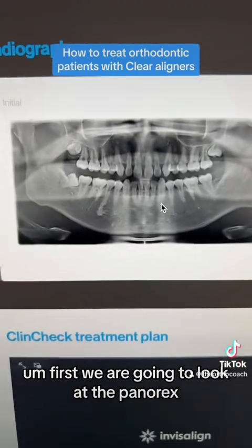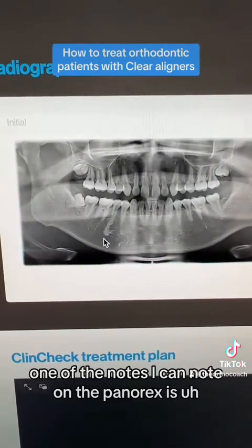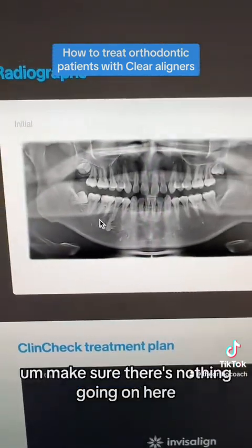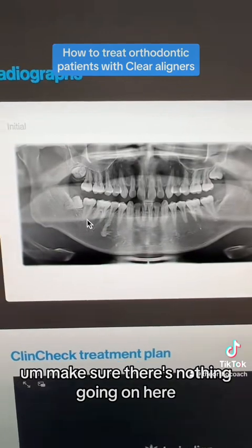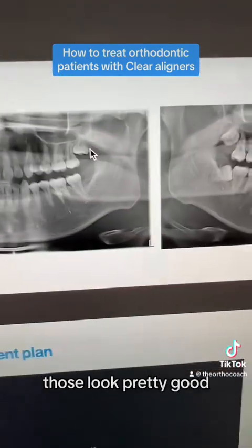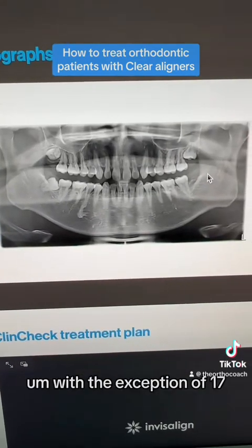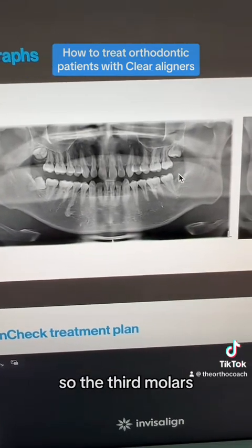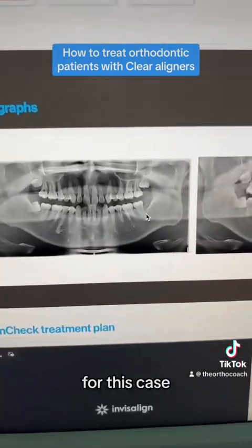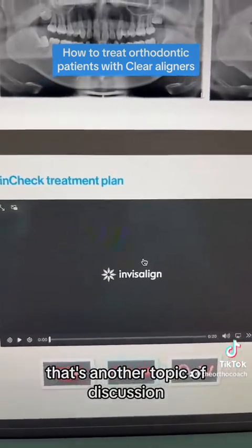First, we are going to look at the panorex. One of the notes I can note on the panorex is I think I would check this out. I don't know what that is on the x-ray. Make sure there's nothing going on here with pathology. I would look at the condyles. Those look pretty good. And then I do see the third molars with the exception of 17. So the third molars, I think it would be a good idea to get those out. I don't see a ceph for this case, which is a problem, but we'll just move on from that. That's another topic of discussion.